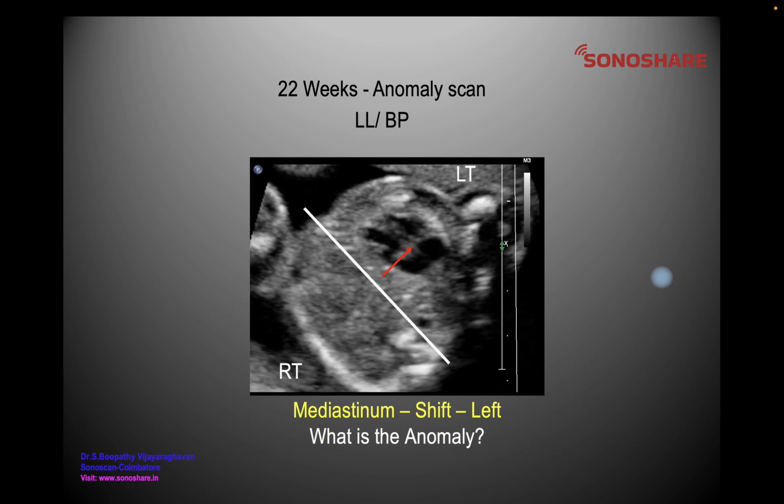So, what is the anomaly? I can guarantee you that you could not have thought of the diagnosis from this image.